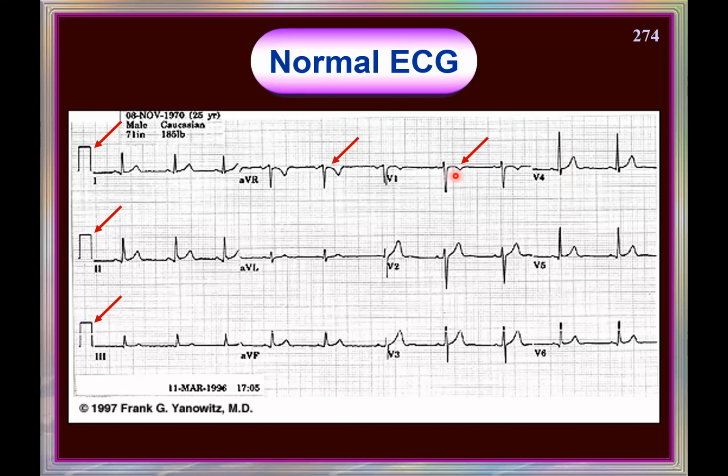Whereas this is the right-sided lead, the current is directed down, left, and anterior. That is why whenever you have a left-sided lead, you get a taller complex, and the right-sided leads register a negative complex.